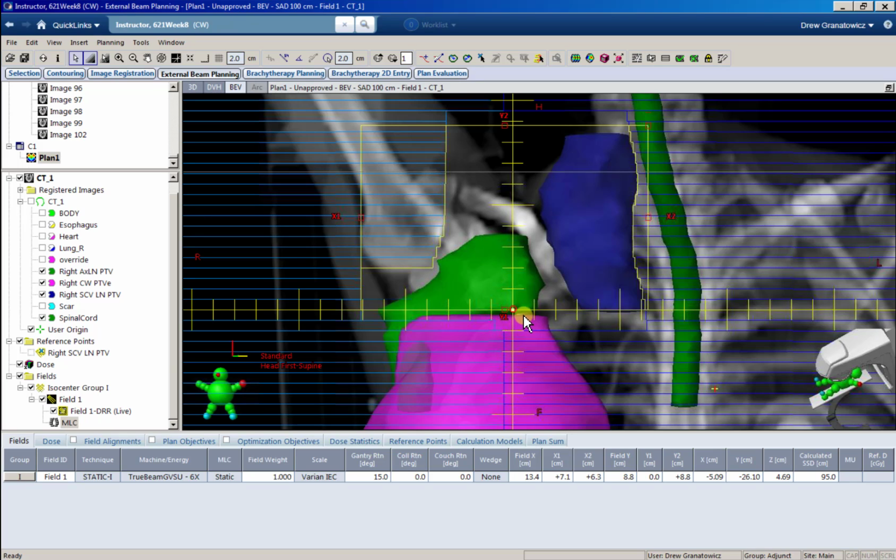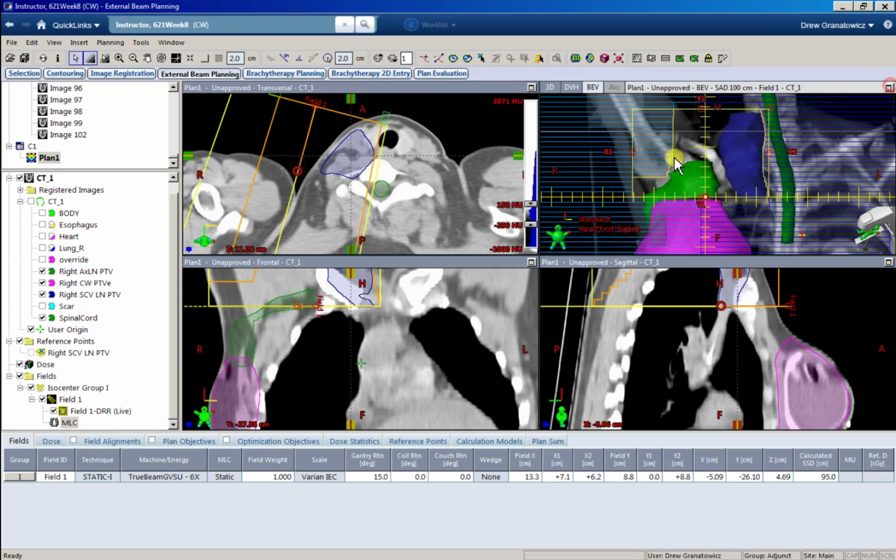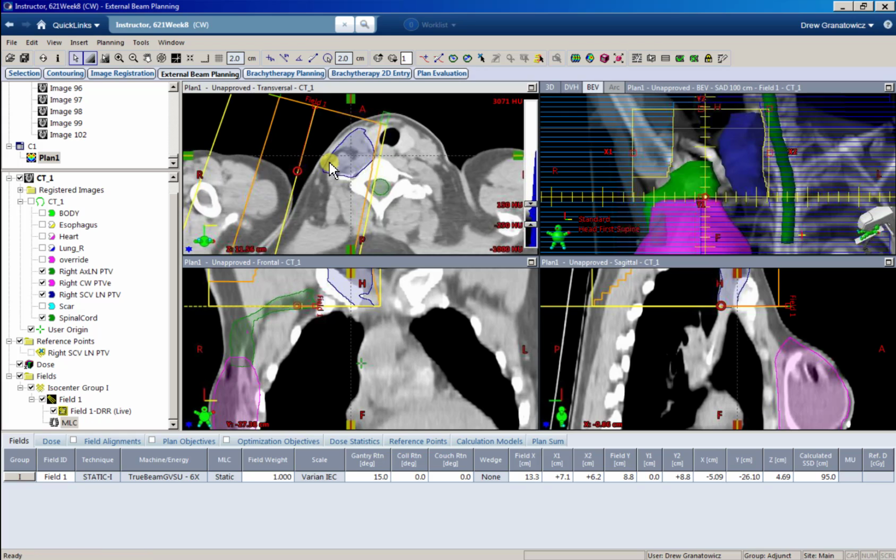So a lot of times I come slightly under my bottom jaw here because it just helps. I feel like if you open your MLCs up down here, your jaw is still covering, but if you open those MLCs, it just helps get dose to the bottom of this field, which again, I'll explain more in a little bit here. So I'm going to make sure I close this jaw as much as possible against the widest MLC here. That's our superclav field.